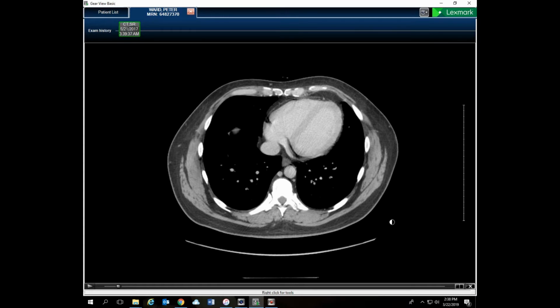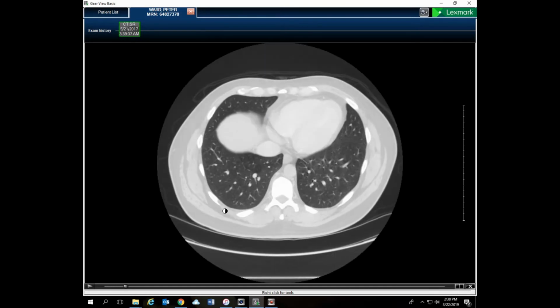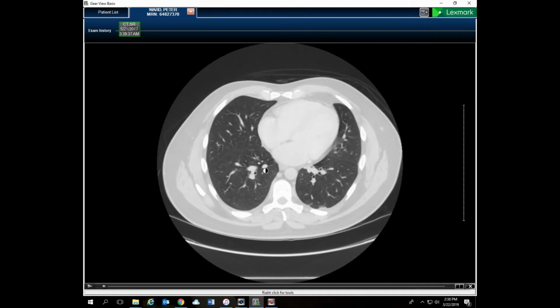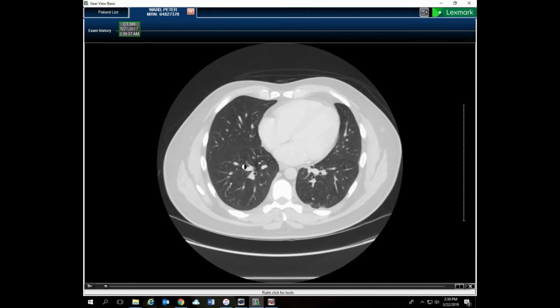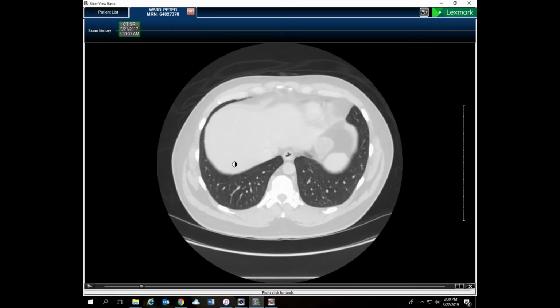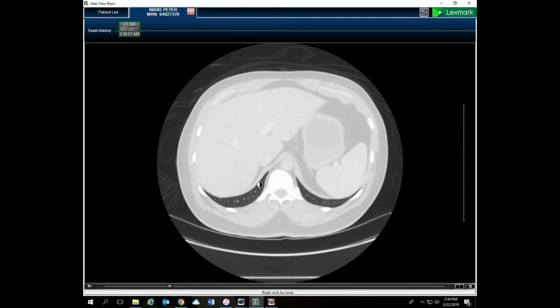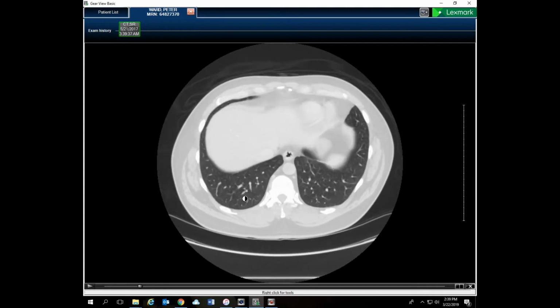So right here we've got my lungs. We'll take a quick detour and actually check those out, because it's kind of a cool picture right here inside the lungs. We can actually see the spaces and vessels in the lungs themselves, a little bit of a starry night appearance, and you can see the fissures associated with each. Here's the left lung, oblique fissure, and the oblique fissure of the right lung. Can't quite see the horizontal one because of how low we are, but here we hit the diaphragm and liver, and the lungs just barely hang on, extending down a bit further posteriorly, but most of that is abdomen thereafter.